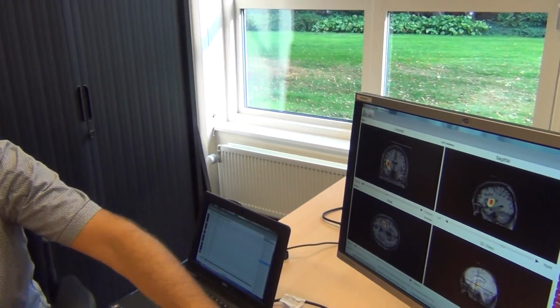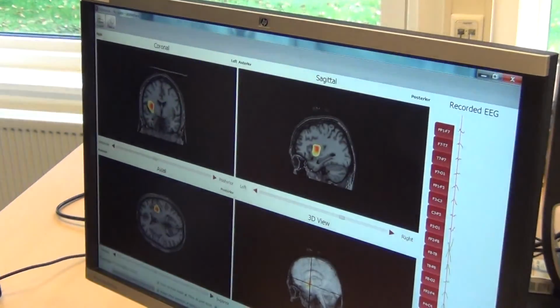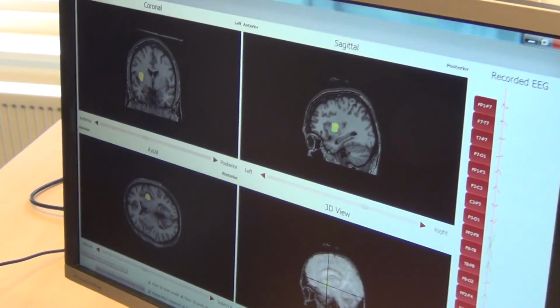I understand. So actually the spatial diagram, the last one that you produce, is by the episode. So if I am a clinician, it's up to me to explore different spatial distributions of the episode in order to make sure that that is exactly the region to intervene on. Yes, and this is not only for one spike, you can also step through time. You can have a look at how the spike evolves.